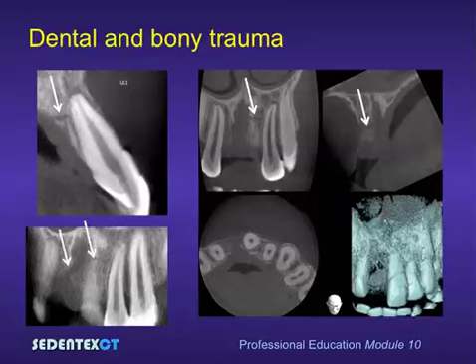The image at the bottom left is another coronal section through a different plane to the one previously on the palatal aspect of the teeth, and we can see an alveolar fracture running horizontally through this region. We also note on the cross-sectional image widening of the ligament space around upper left one.